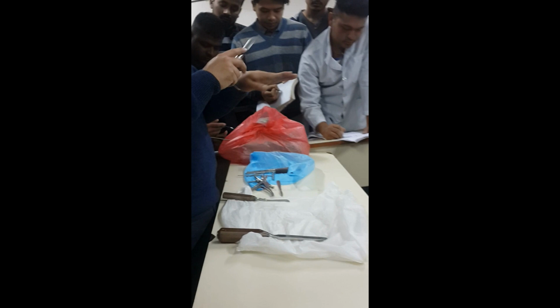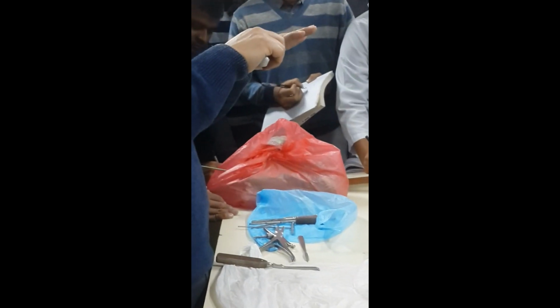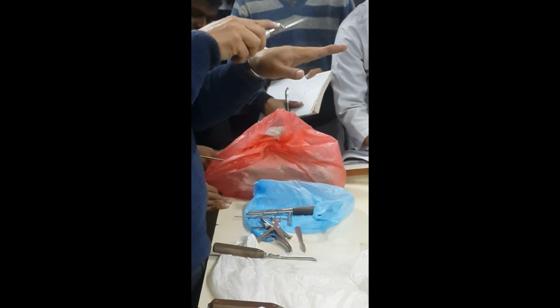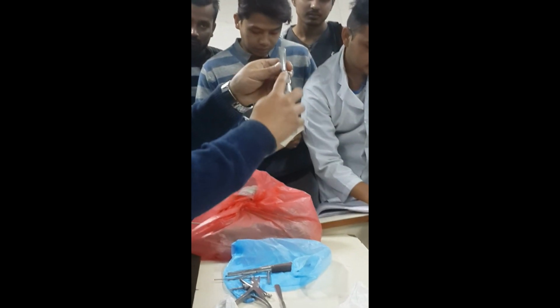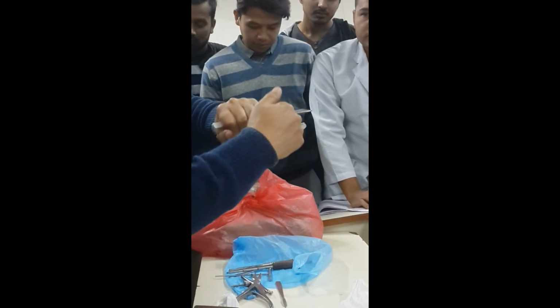And it is mainly done for putting the plate. So there's a bone and the muscles are attached, so you have to strip the muscle to put a plate. In front it will be like this, okay? But the chisel will not have this. A chisel is just to hammer, so you'll not have this impression.